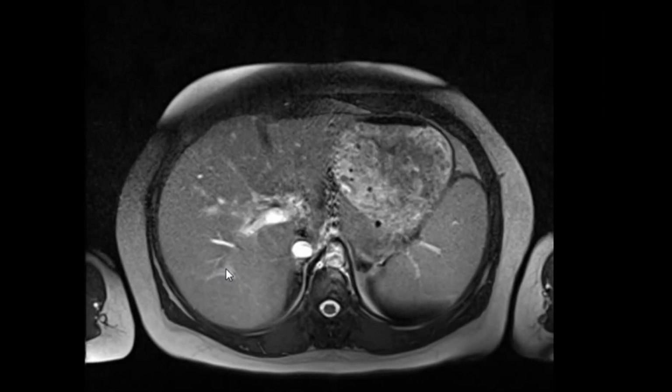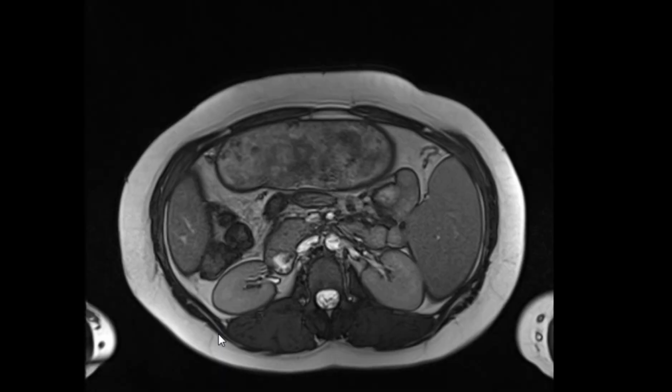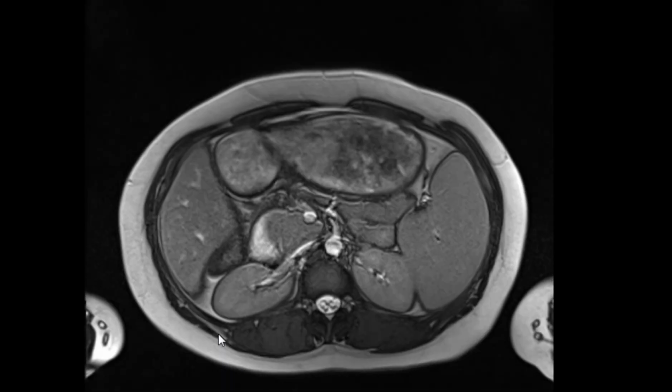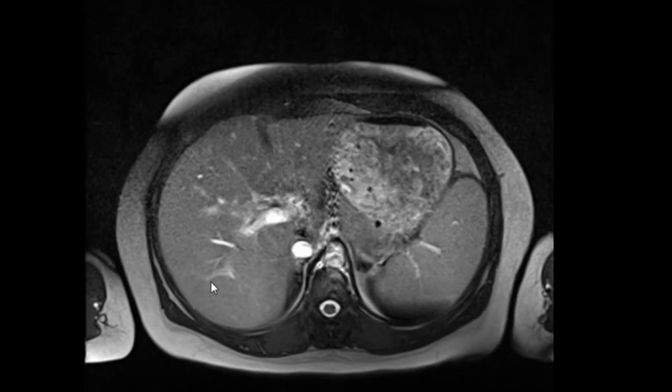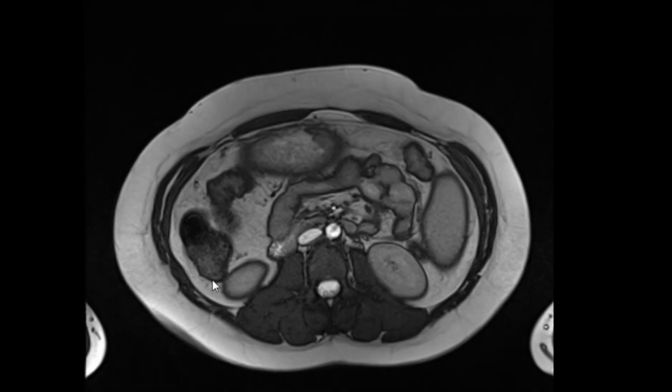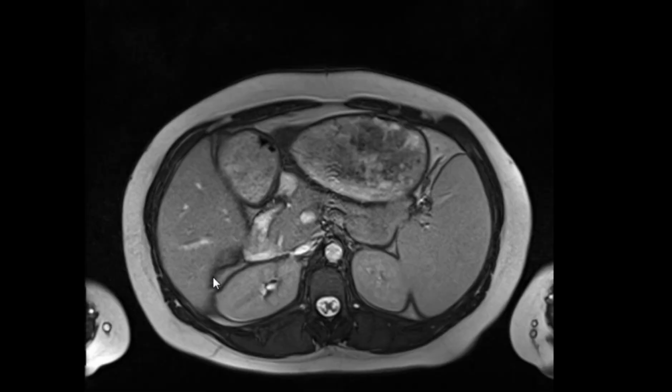Vomiting. Distension. Okay. The clinical history which I gave you, what was it? 30 years old, female, with vague abdominal pain. So there was no history of vomiting, so you should not think of gastric outlet obstruction. But still the stomach is distended, so what are the contents of the distended stomach?